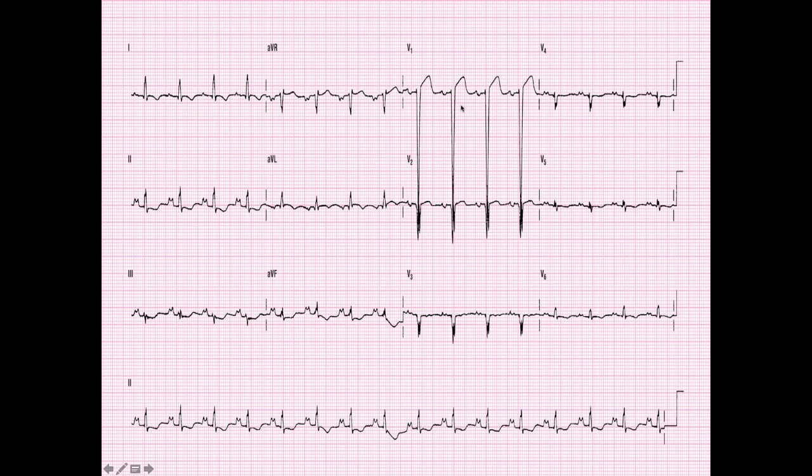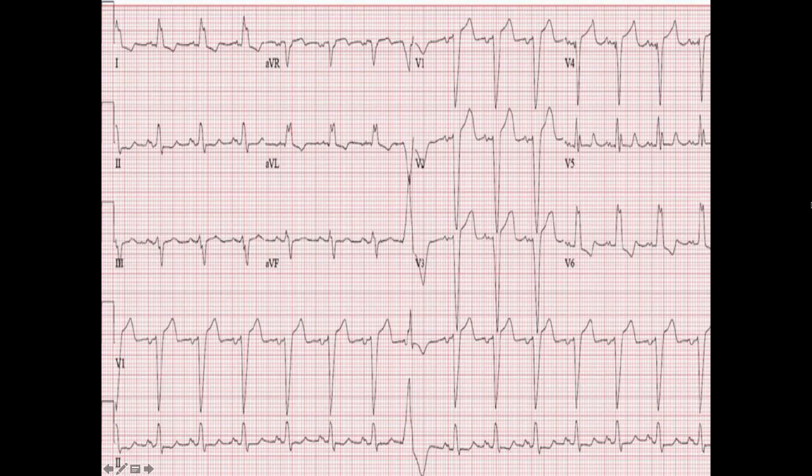We're going to go up to V1 and confirm this. I do have a biphasic P wave, and that second half, that negative half of the P wave, looks a little bit larger than the first half. So we can confirm left atrial enlargement. On this EKG, again, let's go through our steps. Rhythm is a sinus rhythm. I've got P waves. They all kind of correspond and look nice with our QRS complexes. Axis: lead 1 is up. aVF is mostly negative, so I've got a left axis deviation. Well, we're going to split hairs a little bit there. So let's look at lead 2.